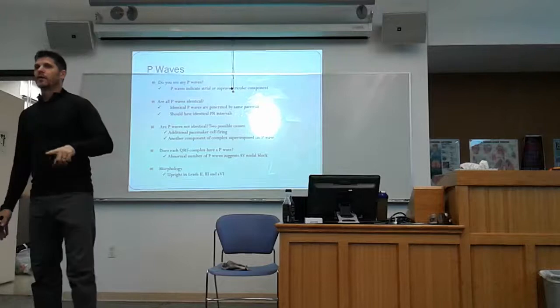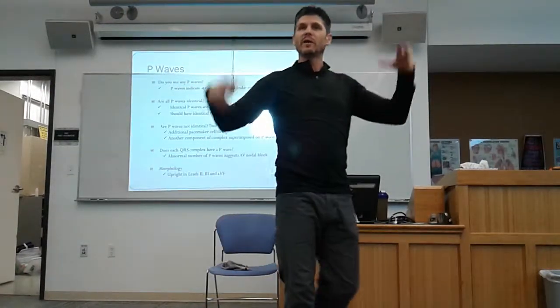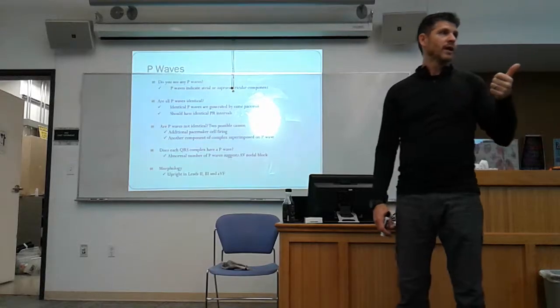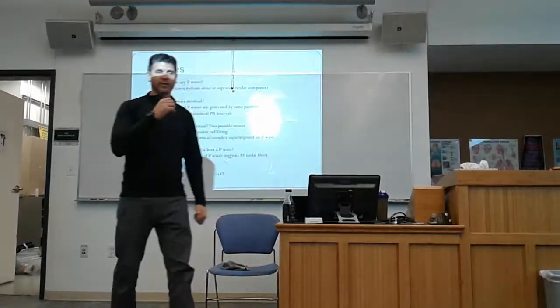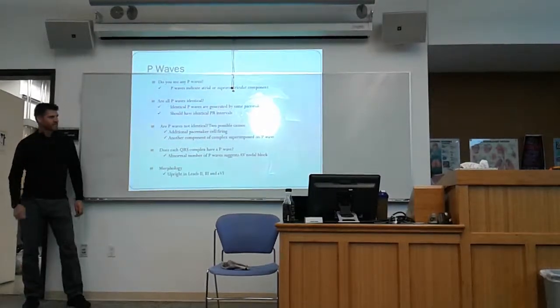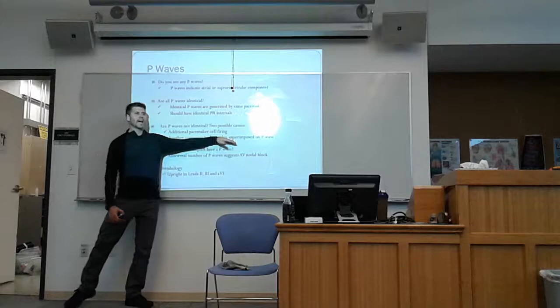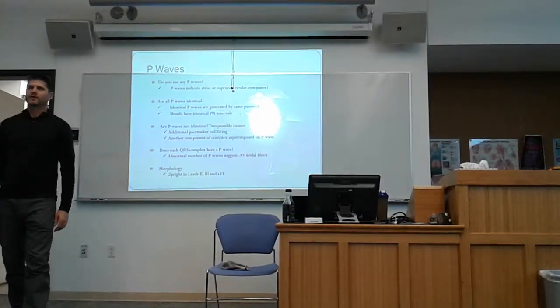Or the pacemaker is the same, but something else is happening that is being superimposed on top of that P wave somehow. Artifact, maybe. Maybe a different component of something that's happening in the heart at the same time. And you'll learn how to figure that out. We'll talk about how to identify that in a minute. You'll have to identify if it's different pacemaker sites, or do I have the same pacemaker site, but every once in a while something's popping on top of that pacemaker.